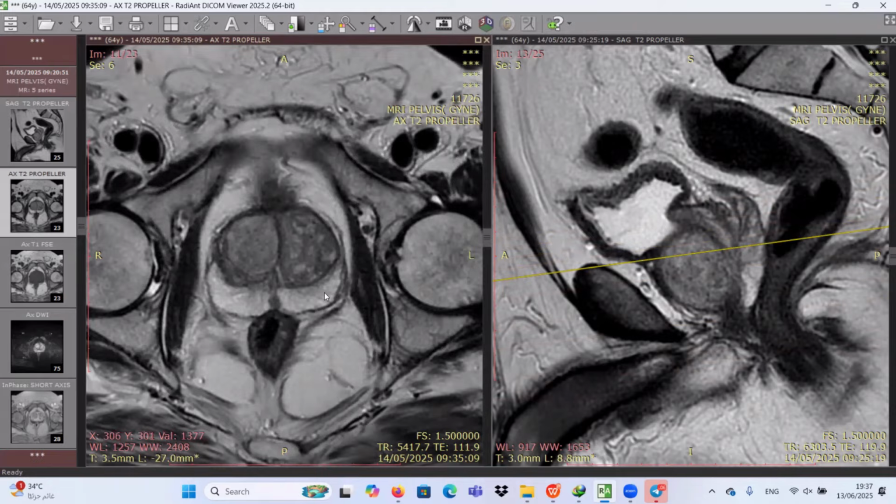I would like also to emphasize that in benign prostatic hyperplasia, the predominant component is the transitional zone and central zone, and together these zones are called central gland. So if I say central gland of the prostate, central gland means transitional zone and central zone. So it is different. Central gland is different from central zone. Central gland means I combined the transition zone and the central zone together.